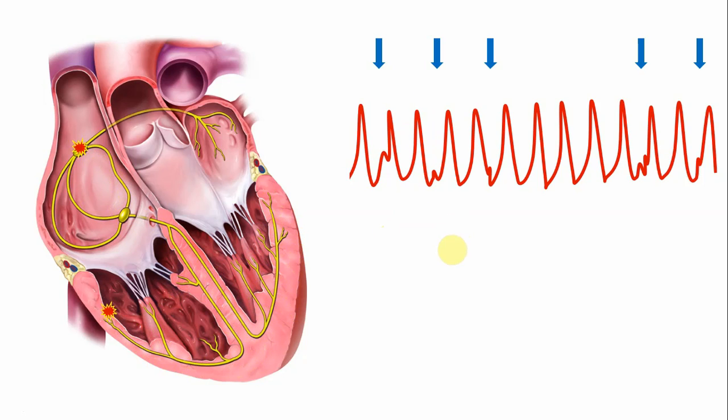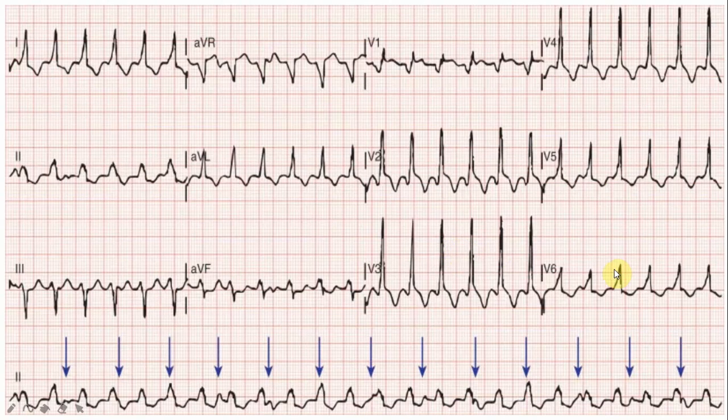All right, now let's look at the 12-lead ECG to illustrate this even better. So we have got a rhythm strip here where we have got some P wave which is reflected by these arrows to make life easier. This P wave is followed by a QRS complex, which is great. So it may be a sinus rhythm, but the next P wave is weird.